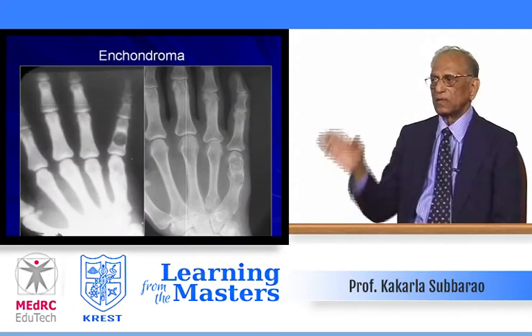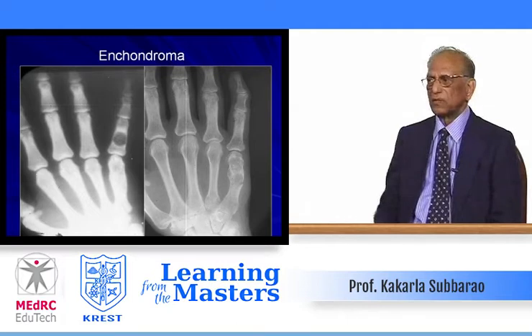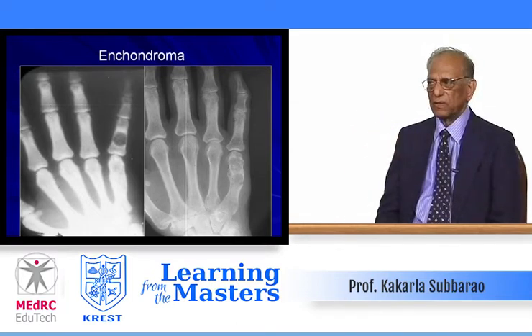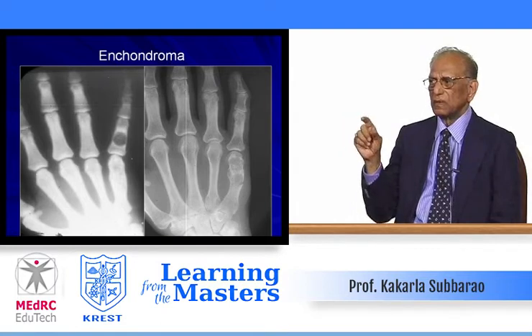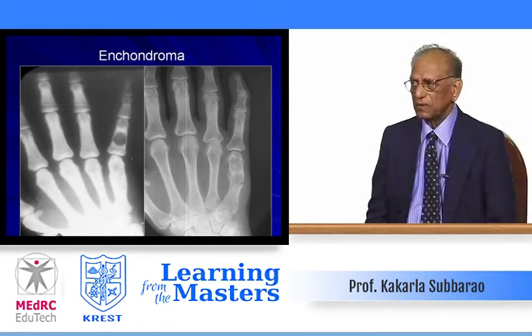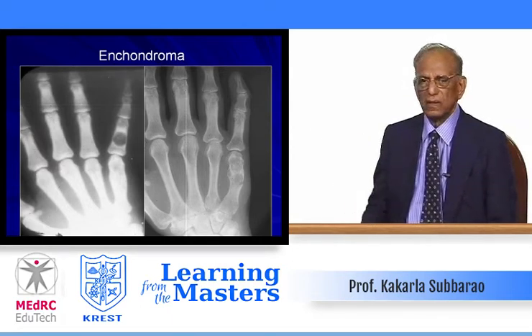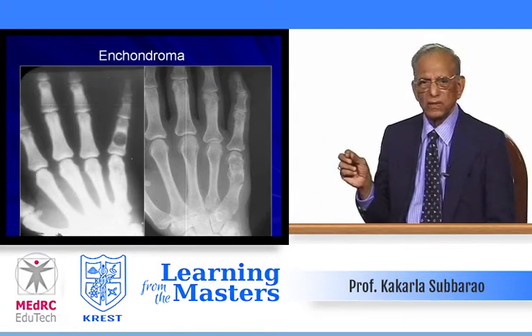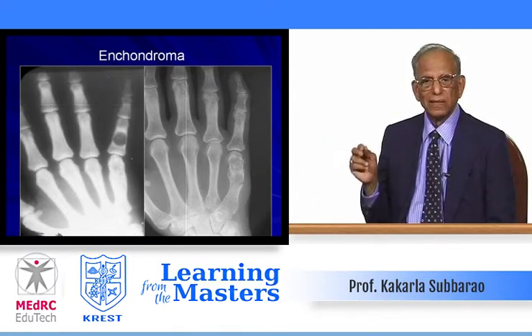Chondroma, classical lucency with surrounding sclerosis. Sometimes you may see punctate type of calcification. Multiple chondromata also occur. In fact, if you look at the fifth metacarpal on your left hand side picture, there is marked sclerosis and some calcification. There is a healing chondroma.